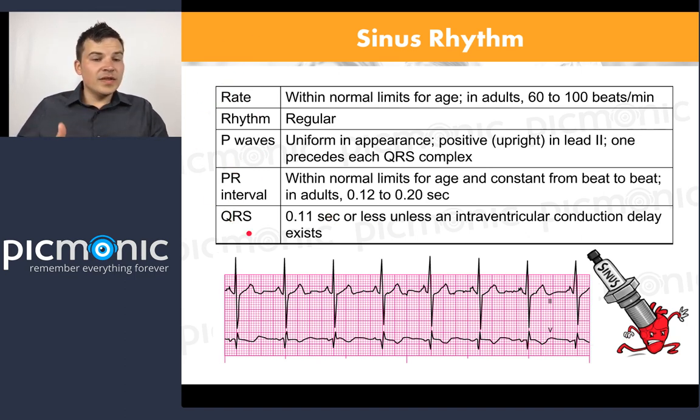In a sinus rhythm, let's look at the rate first. What is the rate? Let's say this is a 6-second rhythm. What's the rate here? Someone tell me the rate. Somebody count. I can't count today.